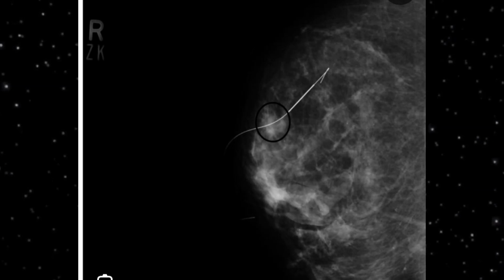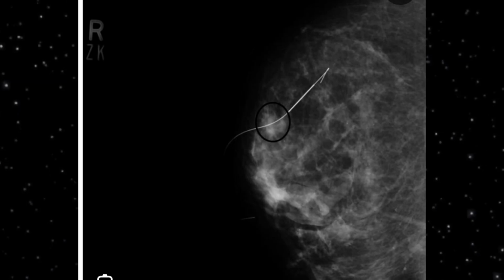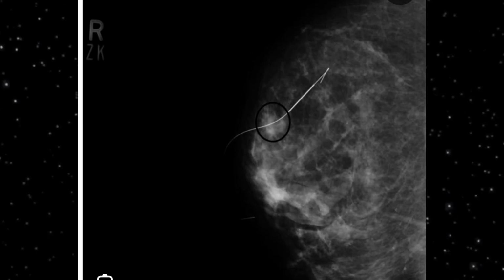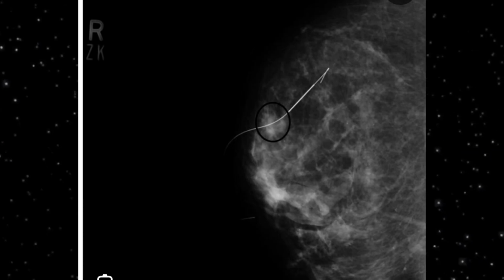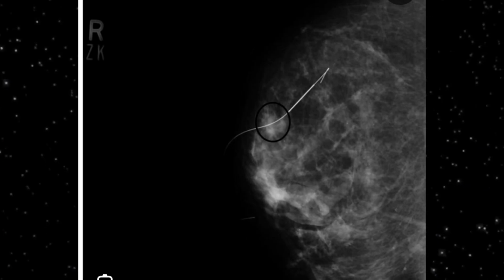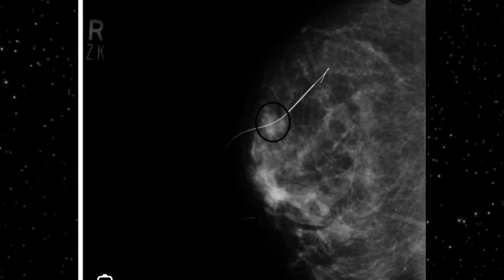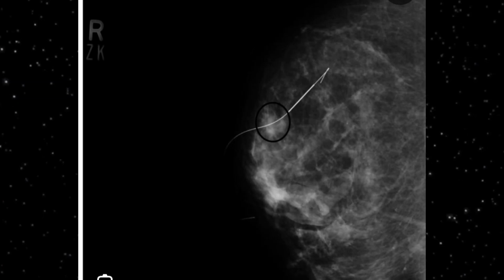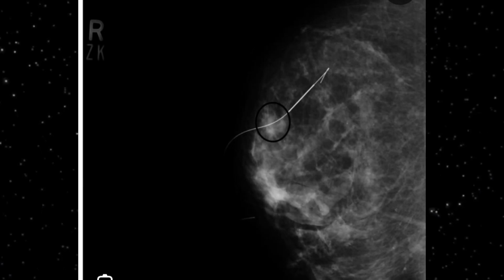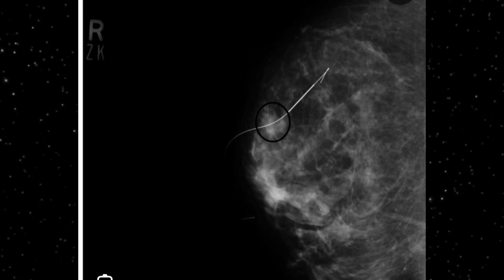On the mammographic images, you can appreciate what the true lateral view looks like. As I mentioned, this is a supplementary view, and it will help you to distinguish superimposition of the normal structures from a real lesion. If you think that something is lying in the lateral area, the true lateral view will help you, and the lesion will pop out and be easily recognized on this true lateral supplementary view.